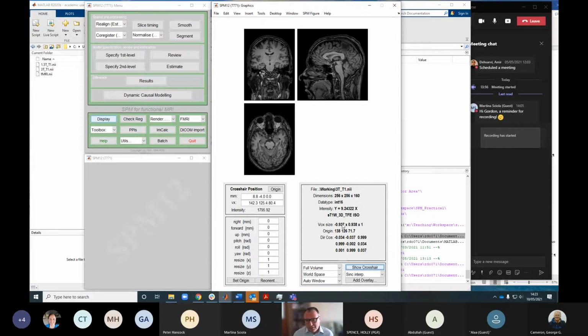So essentially the voxels are counted going from right to left rather than left to right. A negative voxel size in this case is not the size. The negative relates to the direction that the matrix is sampled in our three-dimensional matrix.